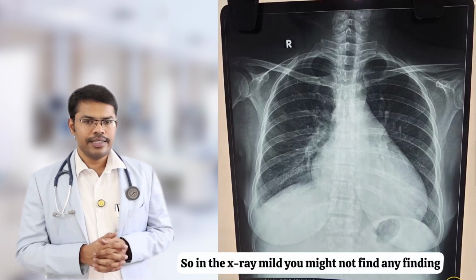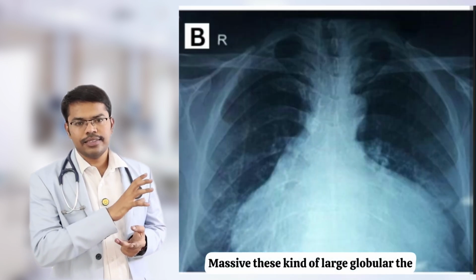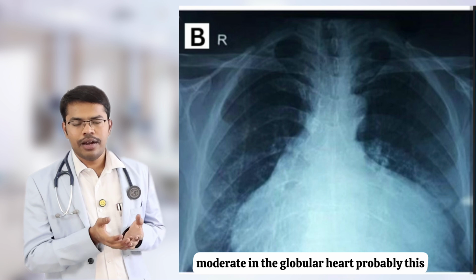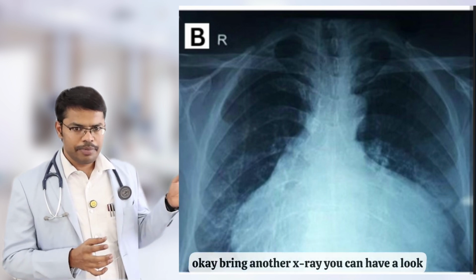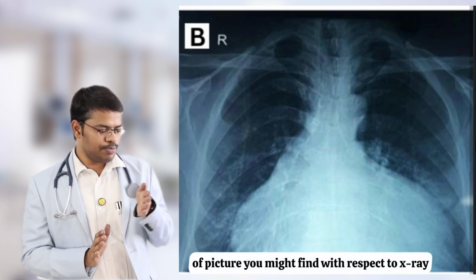So in the X-ray, mild, you might not find any finding. Massive, this kind of large globular, the typical water bag appearance might be there. Moderate, the globular heart, probably this kind of typical appearance might not be there. We're keeping another X-ray, you can have a look. This is some kind of cardiomegaly type of picture you might find with respect to X-ray.